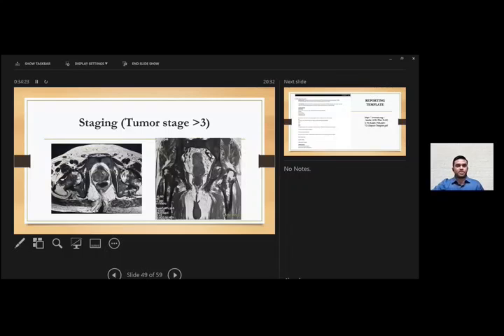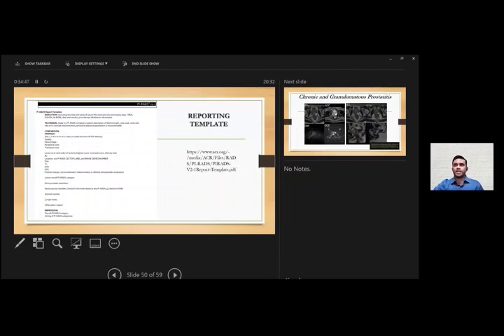Once in a while, we get patients who have extensive metastasis. As in this case, we can see ill-defined T2 hypointense bone marrow changes throughout the pelvis and the intertrochanteric region of the femora. Mind you, because prostatic bone metastases are sclerotic, these lesions will be dark on T2 and T1 images. So finally, the ACR has given a reporting template for PIRADS, which makes our life easier and is a good guide to reporting a multiparametric prostate MRI.